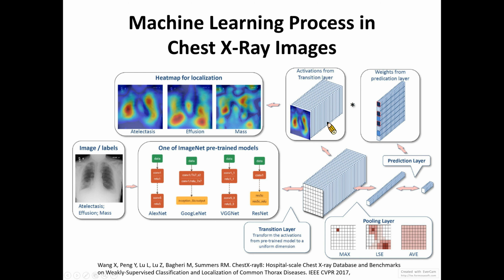Then Google should show you the result here, transfer learning using AlexNet. This is one of the examples provided by MATLAB to show how to do transfer learning.